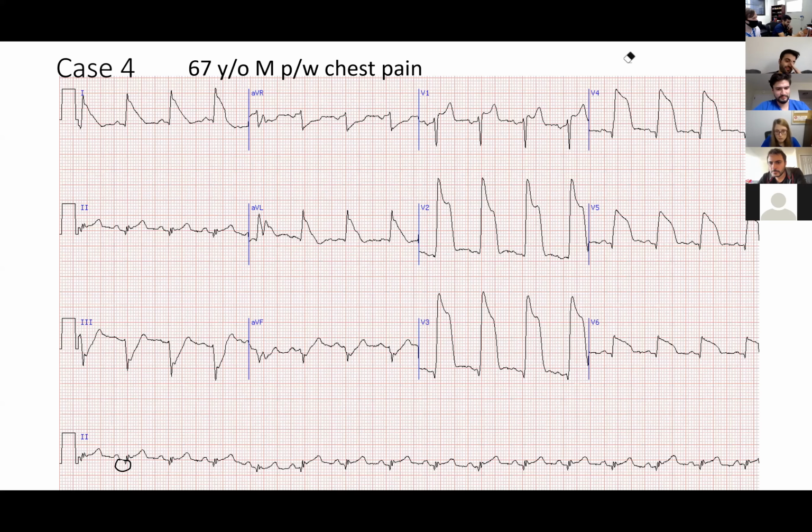I usually start with rate, I guess. So this is really odd. Give me one second. 300, 150, 100. It's about 90-ish, I would say. Yeah, he was using an account method. Okay, yeah, because it looks regular to me. I'd say I agree.